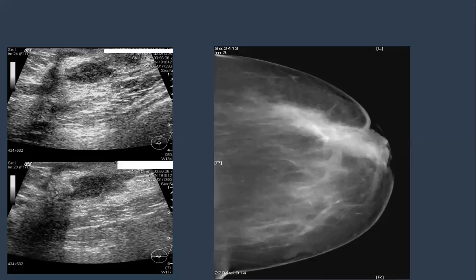Okay. Yes, this is chronic. Chronic what? Chronic abscess. Yes, these are chronic abscesses with discharge. And if I remember well, that case... What do you expect it to be? Idiopathic granulomatous mastitis. One of the differentials, idiopathic. And if it is not idiopathic, yeah, you are right.